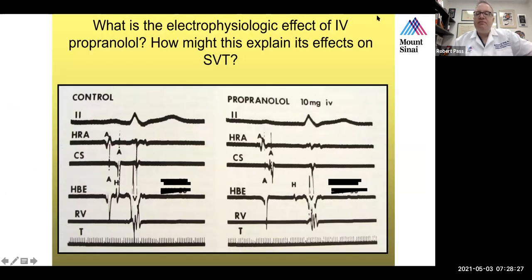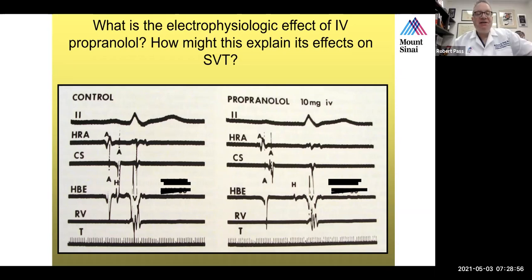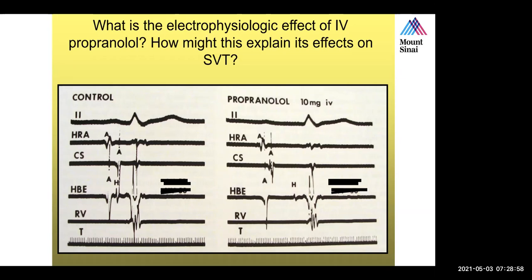Okay, this is an example of a patient who has received IV propranolol. And I am going to ask Dr. Perna Bonsall, who has been arduously working all weekend, to tell me what the effect of propranolol seems to have been in this patient. Good morning, Dr. Pash. Good morning. I should say good day. You and I have been talking continuously 24 hours.